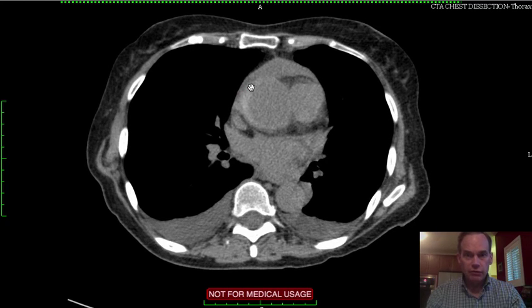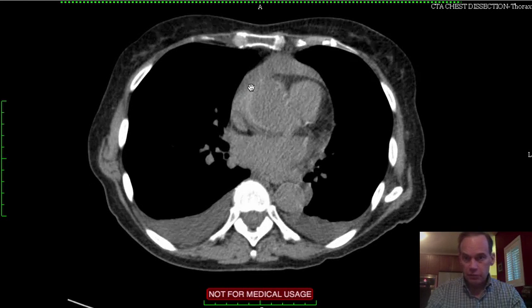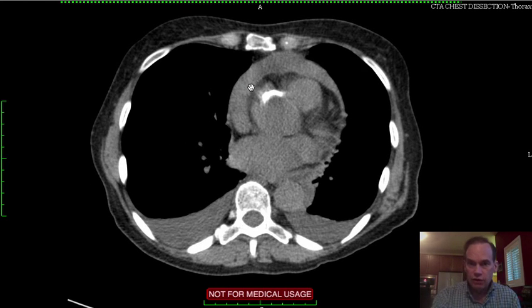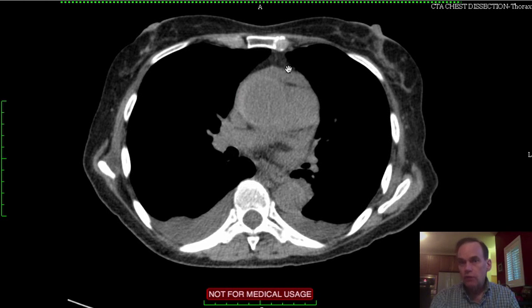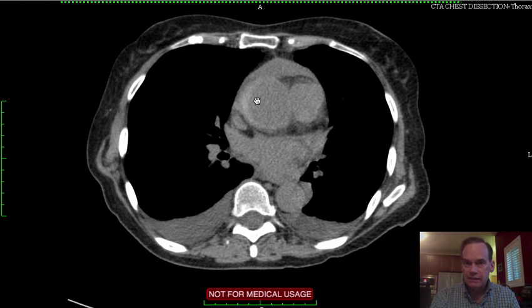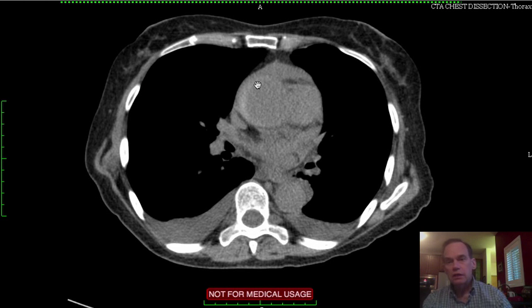What else do we have? Well, something is abnormal here. This is kind of crescent-like, but it is outside of the heart and outside of these great vessels, and this is a pericardial hematoma. So the hemorrhage in this wall of the aorta, this mural hematoma, has extended through the adventitia into the pericardial sac.